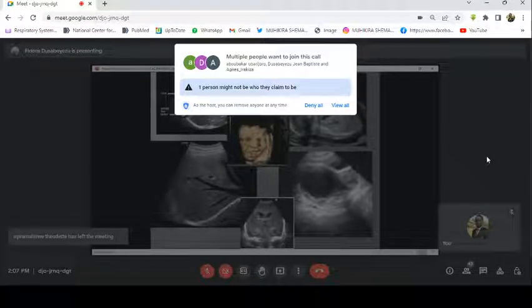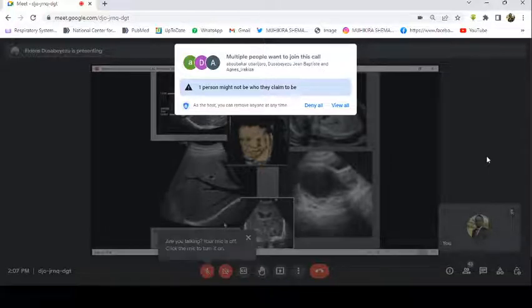On ultrasound, they are dark like this because they don't block, they don't reflect any sound waves, compared to soft tissue that can allow some to pass and others to reflect and come back to the transducer, the probe. So you can get the difference. You can recognize some structures.